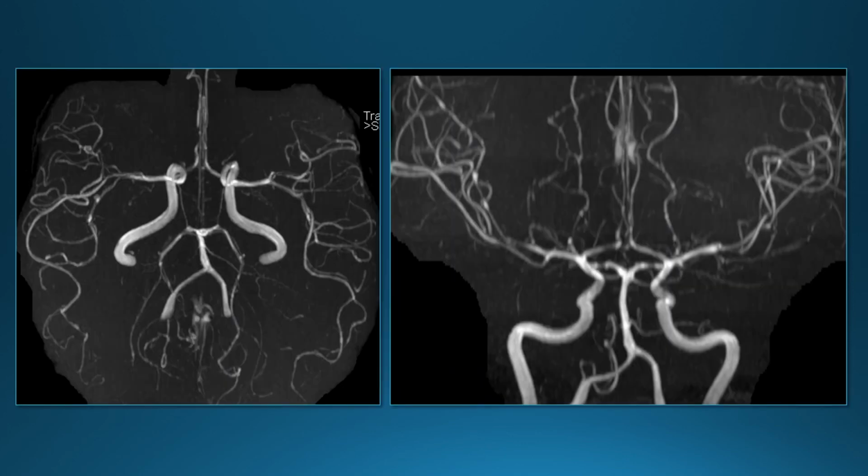She had an MRA, and the MRA was extremely abnormal. So I think you see it best on the coronal images. You can see multiple areas of vascular narrowing. Here's a nice beaded appearance, so you get vascular narrowing, dilatation, narrowing, dilatation. So beaded appearance, which you would say would be characteristic for vasculitis, and multiple vessels are involved. Here's the posterior circulation, dilated, narrowed, dilated, very extensive involvement. However, as I mentioned earlier, lupus does not often cause a CNS vasculitis.